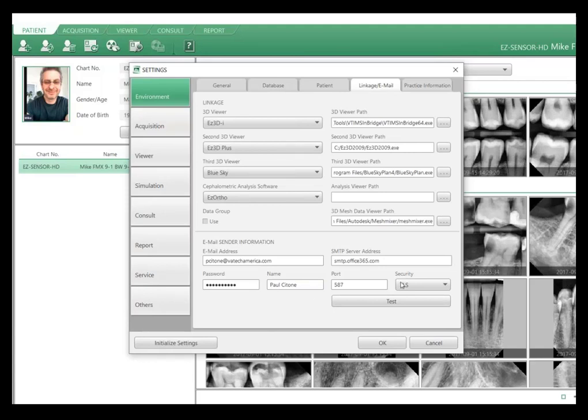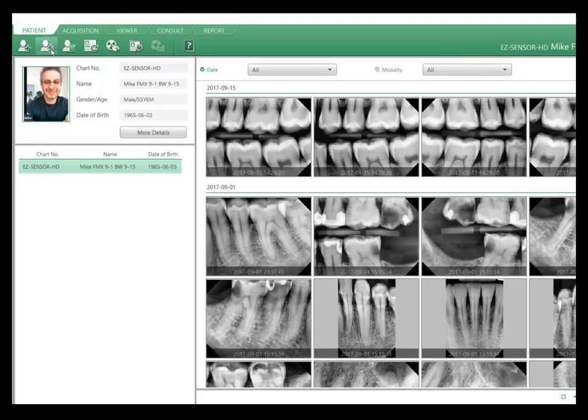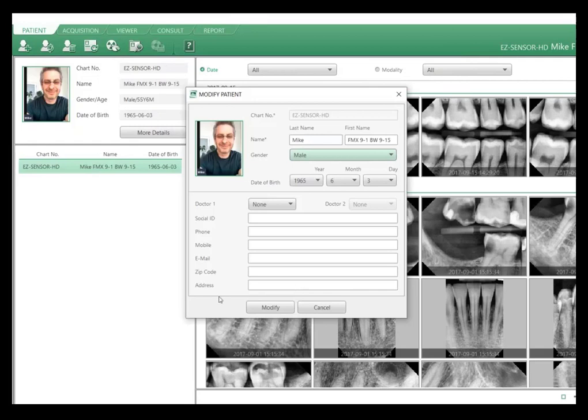to add onto that patient tab. Someone said, there's a lot of different information there. What do we specifically need to add on the patient when we're adding patients?